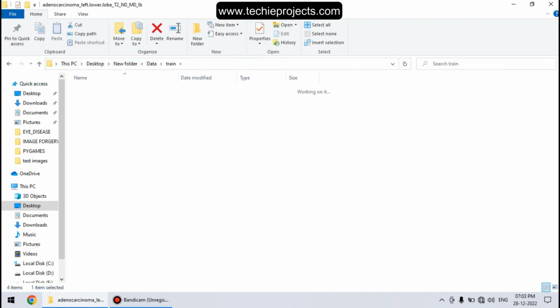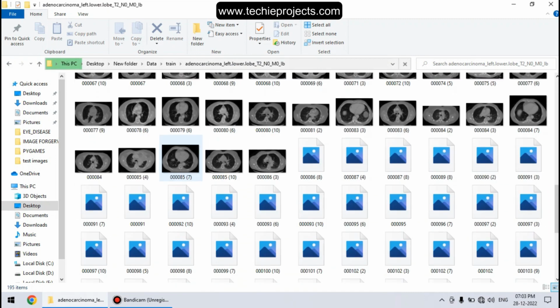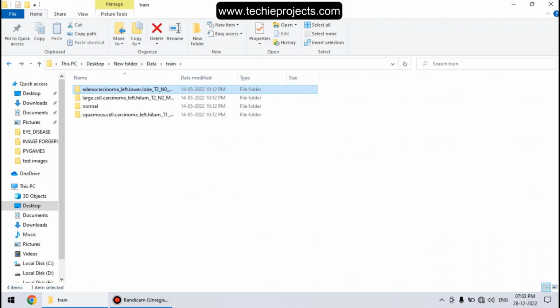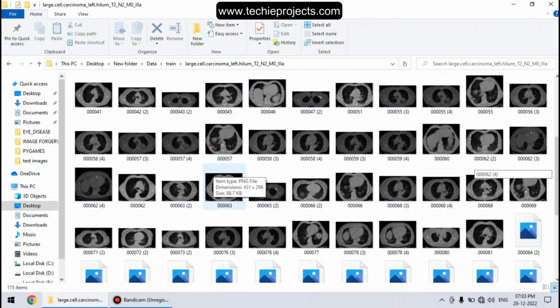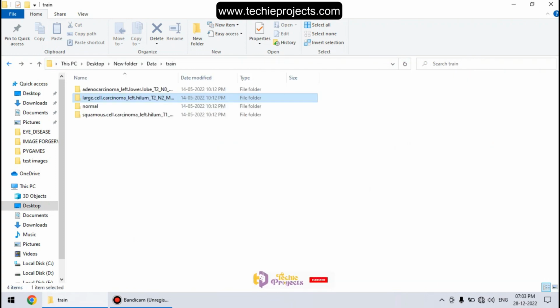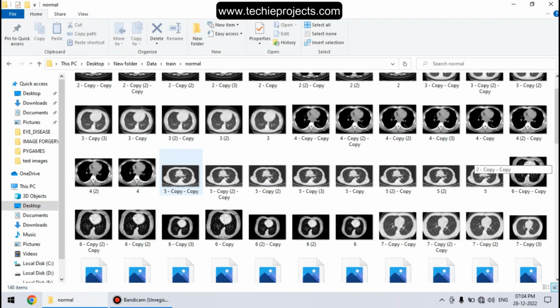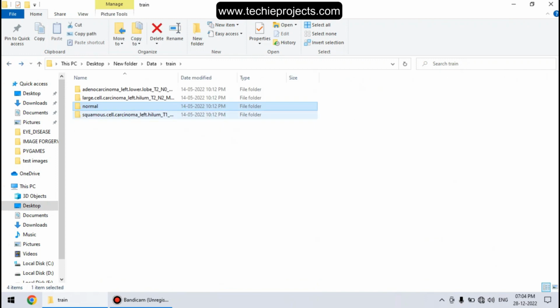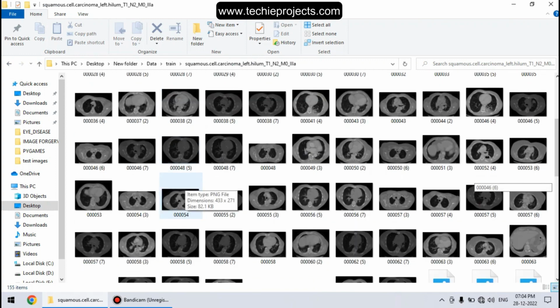These are the validation folder, testing folder and training folder. These 3 folders contain all those images. Just scroll down, go back, and explore the folders one by one. On 4 classes we train the complete model. According to that particular dataset, the model will train, and it will predict which disease the patient is suffering from. So it will classify the type of disease.